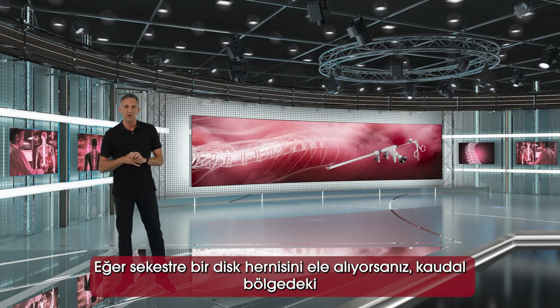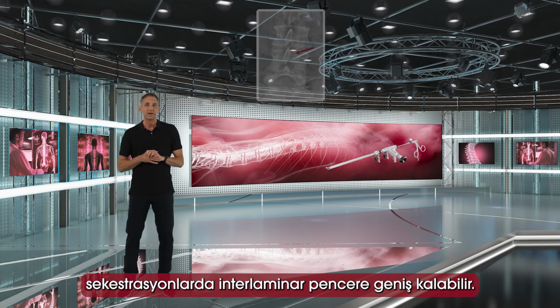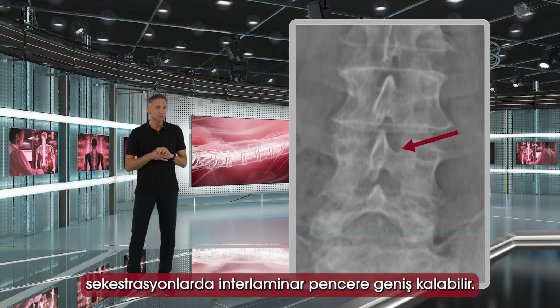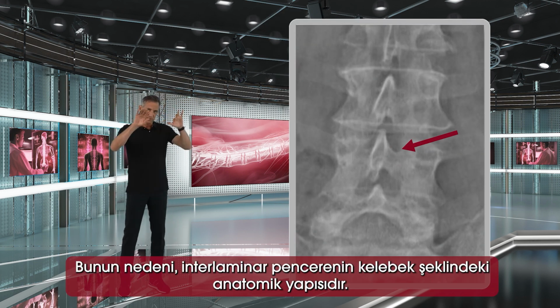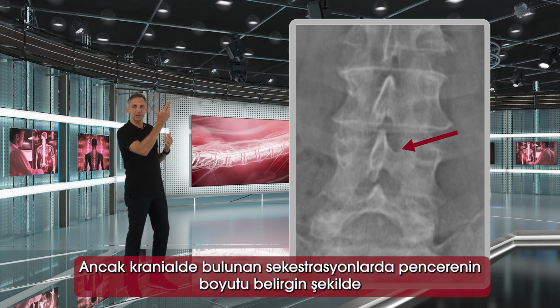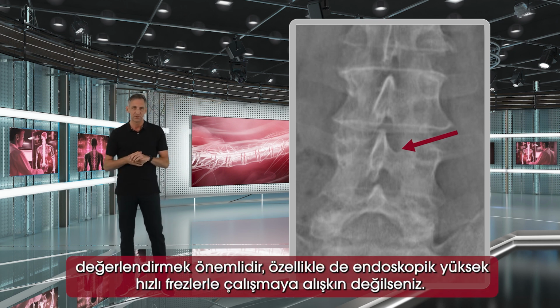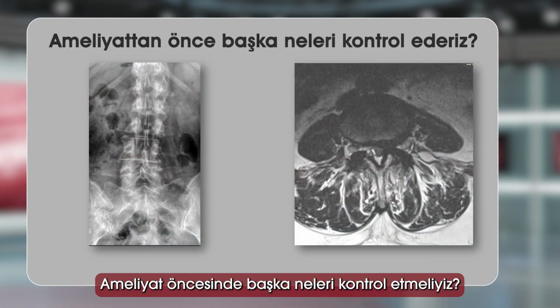So if you address a disc herniation which is sequestrated, then the interlaminar window may still be quite comfortable when it's a caudal sequestration in the caudal area, because of this butterfly shape of the interlaminar window, where it's already significantly smaller when you're going up, and maybe if you have a cranial sequester. So that would be something to check before the surgery, and maybe if you're not yet used to working with the endoscopic high-speed burrs.